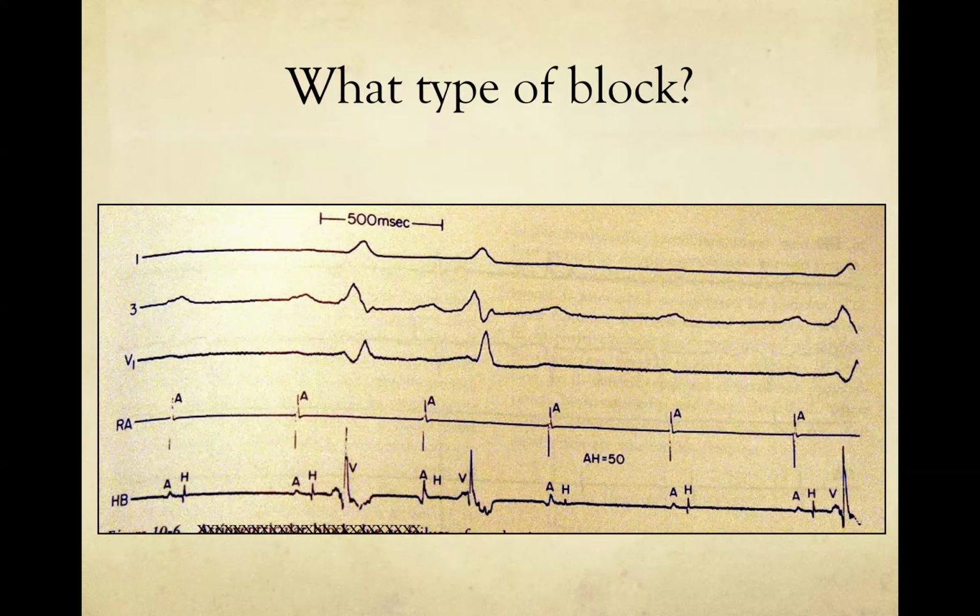That's exactly right. Excellent, Katoki. So what this is an example of is infraHissian block. So we're seeing AHV. Interestingly enough, this actually looks to me like infraHissian Wenckebach.